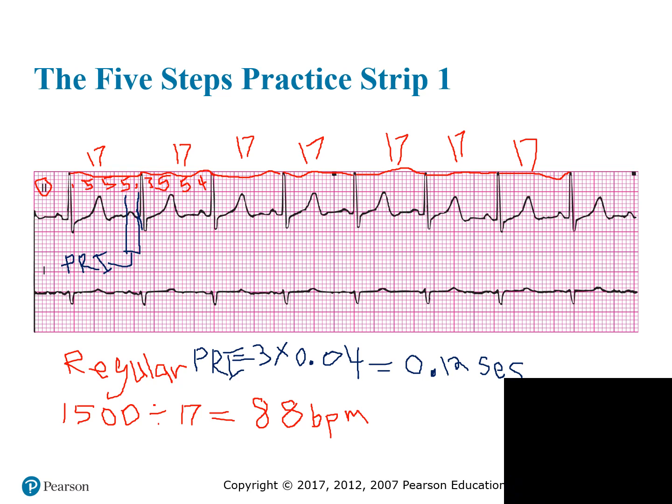So once we establish our PR interval, our next one we have to figure out is our QRS interval. And I think I'm going to do that one in purple so we can tell. Now, maybe not purple. Let's try this green. So, starts at the beginning of Q, which we already have, which is the end of our PR interval.